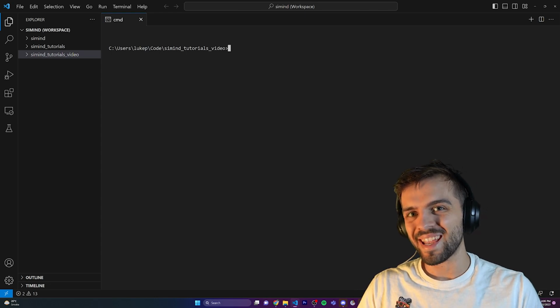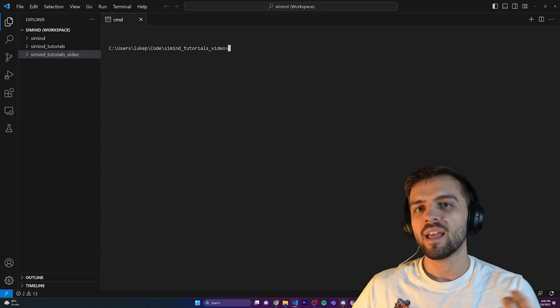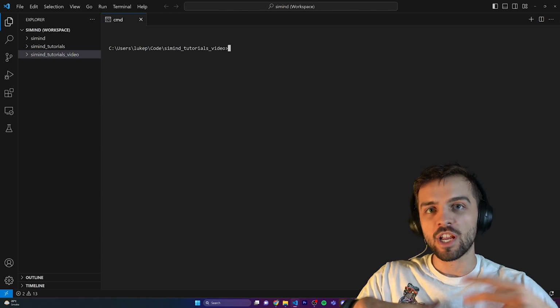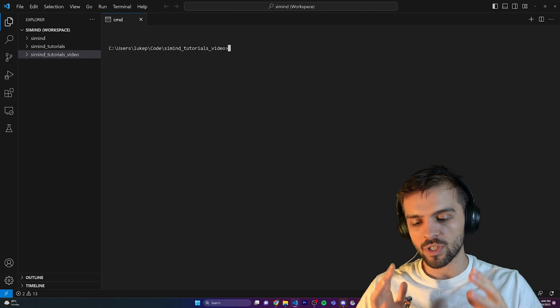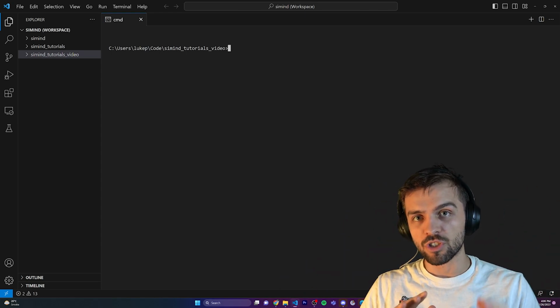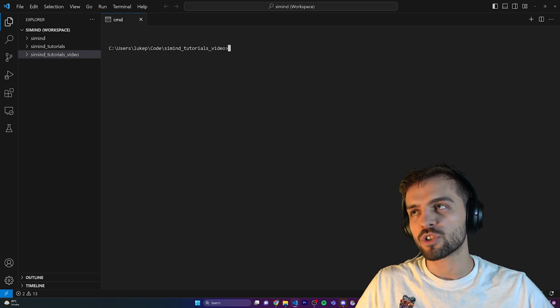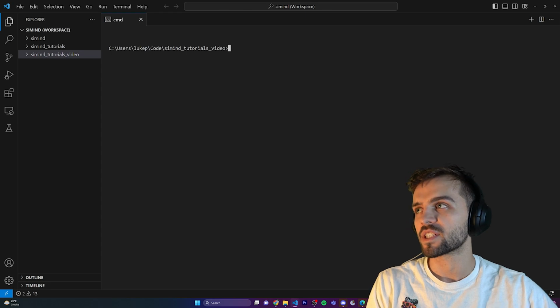There are really two main commands you'll be using. There's the simind command to actually run simulations, and the change command to change parameters of the simulation. Of course, we're simulating a real system. There are lots of parameters that you can change in a SPECT system, so they've developed their own command just for changing parameters and configuring to specific systems.